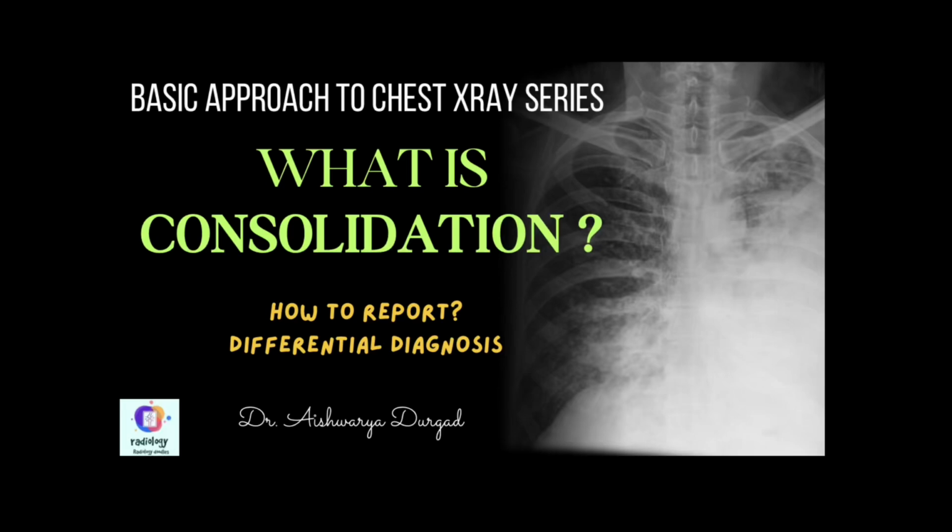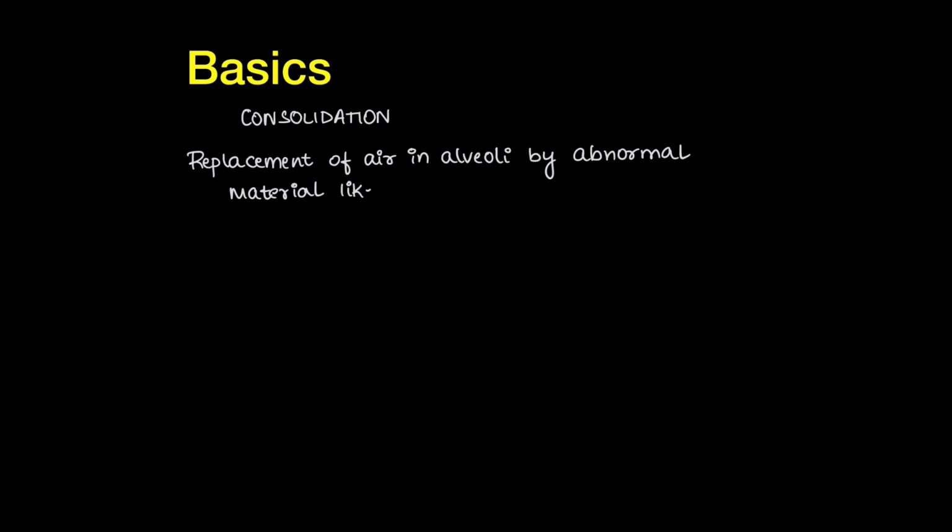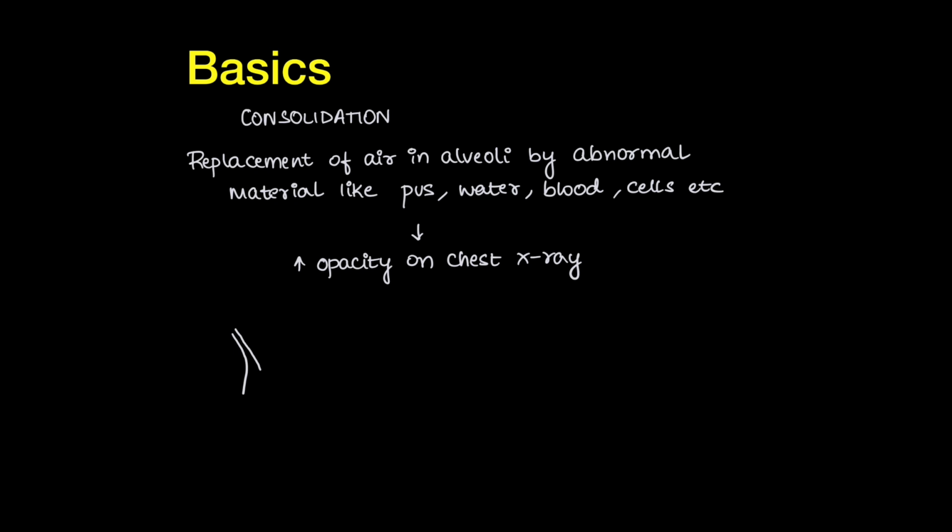In this session of the Basic Approach to Chest series, we learn what is consolidation, how to report it, and its differential diagnosis. Coming to the basics, consolidation means replacement of air in alveoli by abnormal material. It could be anything like pus, water, blood, cells, etc. When that happens, there is increased opacity on chest X-ray.